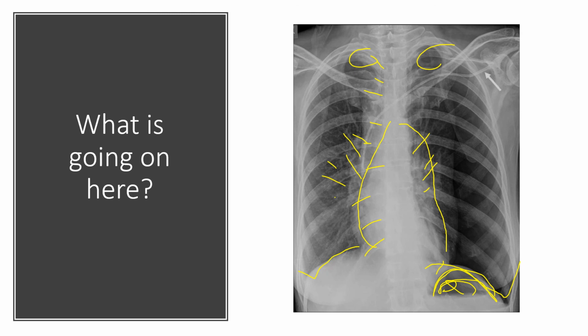So what do you notice about the interstitium? Well, I noticed that I got this solid line here, and then this is very radio opaque inside, and outside it's very radio lucent. So what do you think caused this? Right? This is a classic pneumothorax. Well, okay, great. Well, what caused the pneumothorax? Well, what do you notice here? This thing terminates in the superior vena cava, and it was inserted behind the clavicle. So this is a central line that they tried to do subclavian to go into the superior vena cava, right?